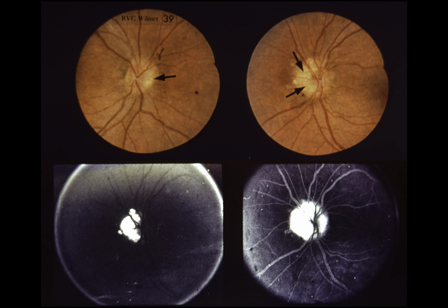Upper left. The right optic disc contains large, yellow, glistening drusen at its nasal border. The retinal vessels are normal. Upper right. The left optic disc also has glistening drusen that are particularly prominent at its nasal aspect. Lower left. Fluorescence of the drusen is seen prior to injection of fluorescein dye, a phenomenon known as autofluorescence. Lower right. 30 minutes after injection, dye molecules adherent to the drusen result in late hyperfluorescence. This patient has bilateral optic disc drusen without visual symptoms or signs.